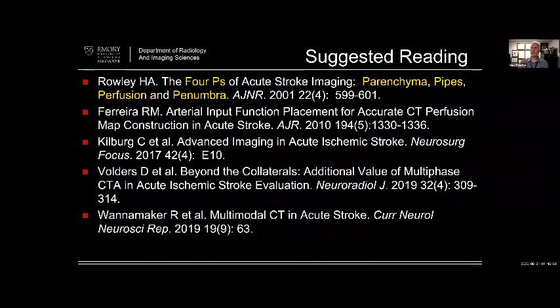So when it's obvious, if an area would be a number, like you would count it off against the ASPECTS number, then it makes sense. But oftentimes I look and I can see the infarct, but it's so early that maybe somebody else would look and maybe they wouldn't see it. And I can understand that. So the ASPECTS number would be a little bit different as far as that goes. I don't know.